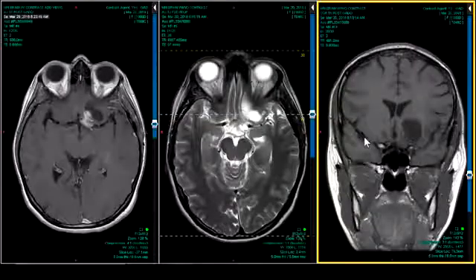Okay, so you have to get familiar with the anatomic considerations of how they're going to actually take it out, so that you can comment on the appropriate things, meaning say, wow, you're going to run into the middle cerebral at the end of this resection, so they're looking for it. Or you can't get this out without... So that's what they're going to start thinking as soon as they see it. As they say in neurosurgery, location is more important than what it is. What it is is most important to us. Where it is in relation to everything is what's most important to them. So you got to get keyed into that.